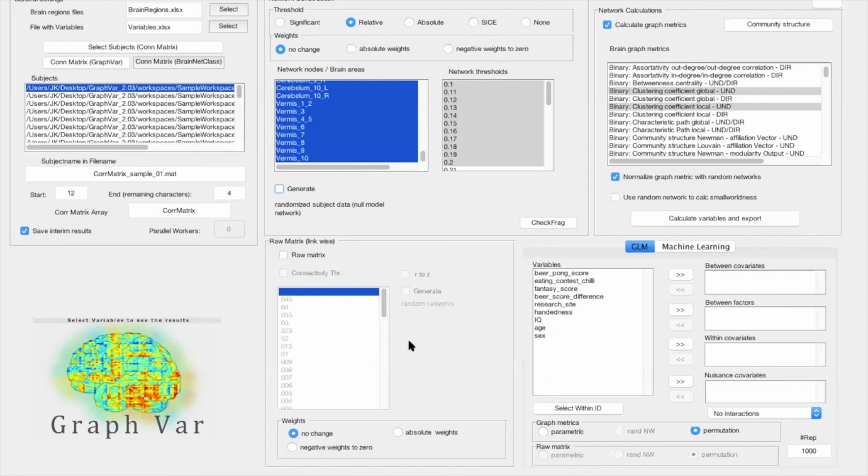So in this case, it could be the raw matrix or the functional connectivity in the raw matrix, or the calculated network theoretical measures by the respective regressors that we put in there. And then if we put two regressors in, it will try to estimate the unique contribution of each of those regressors for our observed variable for the amount of explained variance. So then they are basically controlled for.